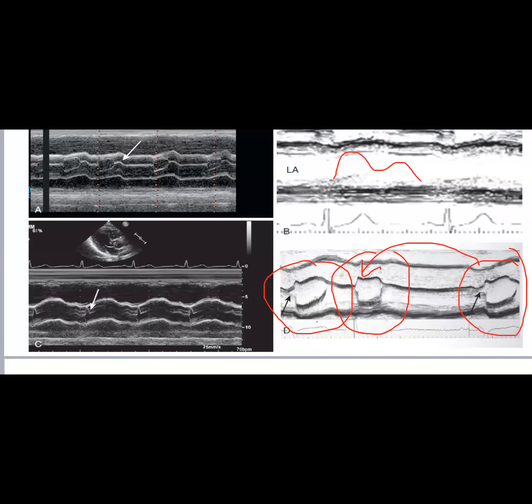So premature opening of the aortic valve after a pause, does it mean anything? Yes, it does. It means, again, a diastolic dysfunction and high LVEDP, because the valve starts to open in diastole. It starts to open in diastole because the diastolic pressure is really high, and exceeding the aortic pressure, and it starts to split the valve open a little bit.